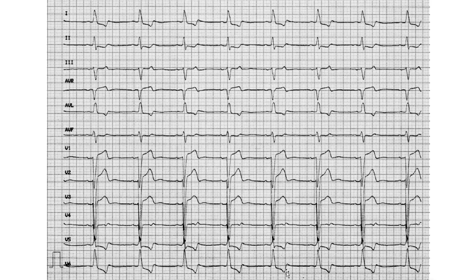So we say, and here as well, because it's in this idea that all of this square and a half is T wave territory. And if we check the other places vertically, this square and a half of T wave territory, it's down here and it's up there, so it's biphasic, pre-terminal biphasic negative, yeah? So that's how you do it.